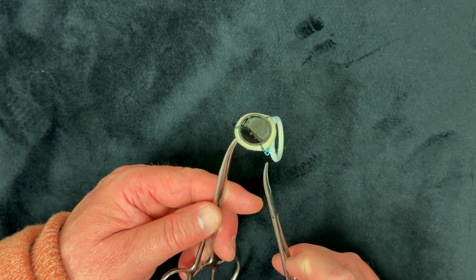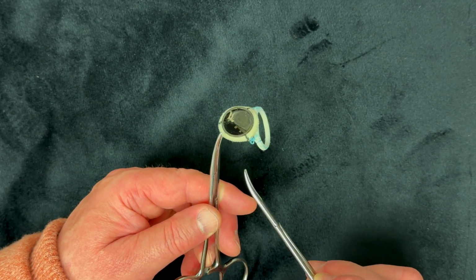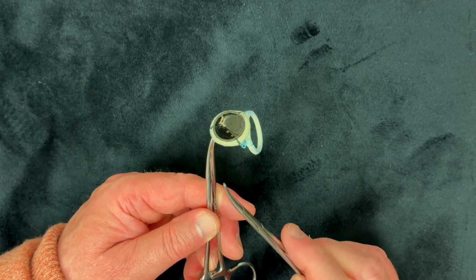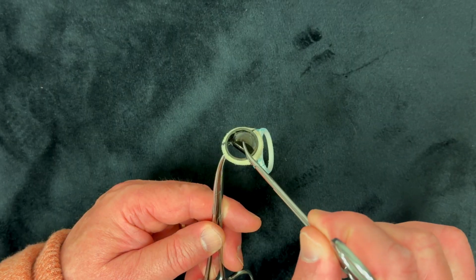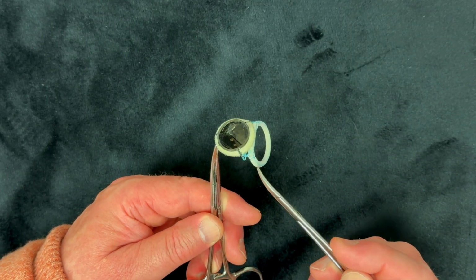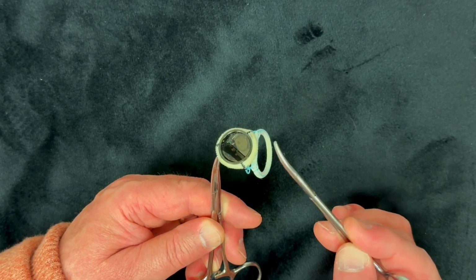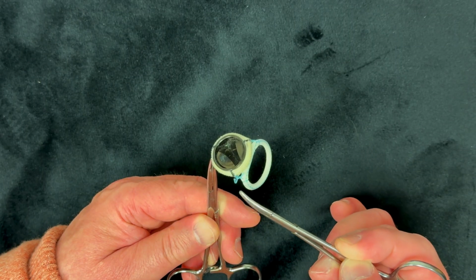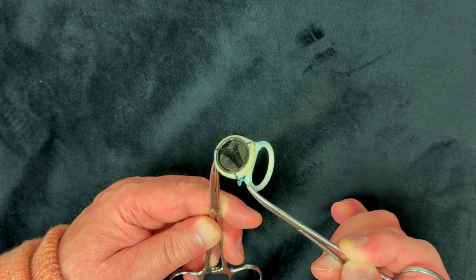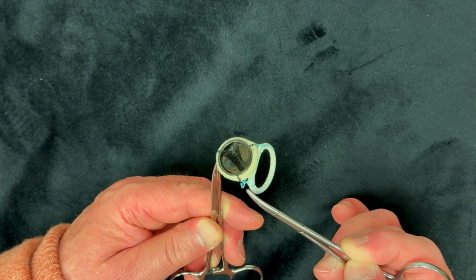We have here a model of the aortic and mitral valve annuli. This is a 23 millimeter St. Jude mechanical aortic valve, and I have attached it to a 26 millimeter Carpentier-Edwards Physio 2 ring. It's been attached by a couple of sutures, which would correspond in the natural valve to the lateral and medial commissures of the mitral valve.